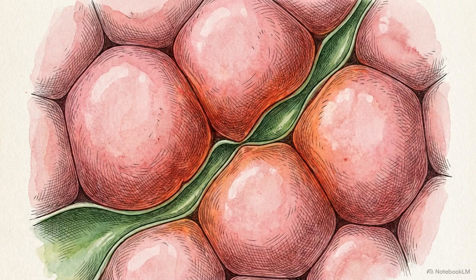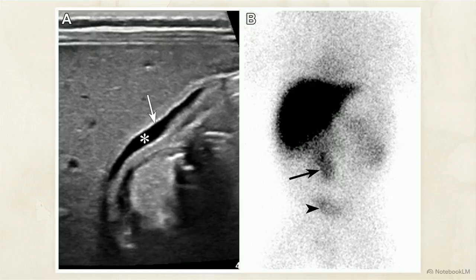However, severe neonatal hepatitis can also prevent the excretion of bile, leading to a scan that mimics atresia. This scintigraphy scan shows the results of severe hepatic dysfunction. High tracer activity in the body and excretion into the bladder suggest that the liver cells are too damaged by hepatitis to process the tracer.